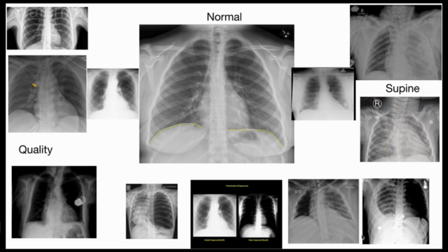Sometimes the pathology may be that the vertebral body is seen, and so on and so forth. These are some of the techniques, the radiographs, where we want them done very well. So that in a nutshell is what we look for in quality. You must ensure that the radiographs are proper before you interpret them.